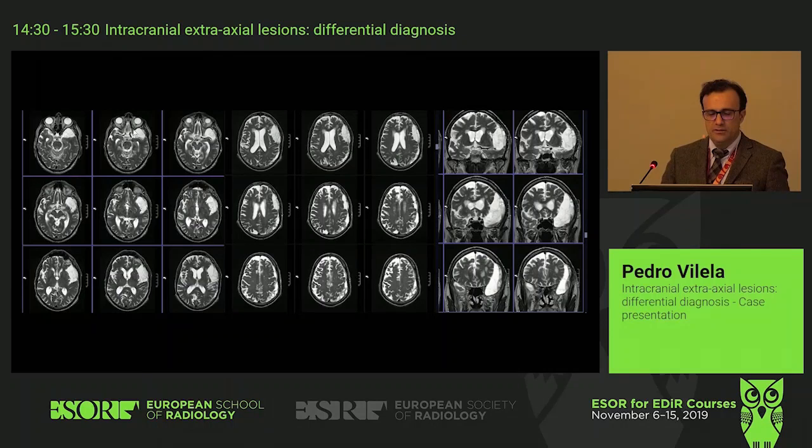Middle fossa, middle cranial fossa, and going into what is this? Sylvian fissure. It's opening the Sylvian fissure, right? Very good. So this is hyperintense. Do you see any other lesion? You think this is the same lesion? Is it the same everything?